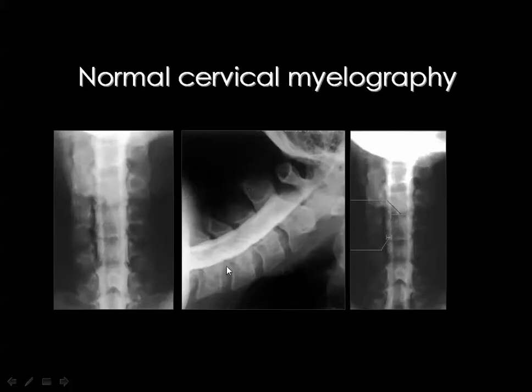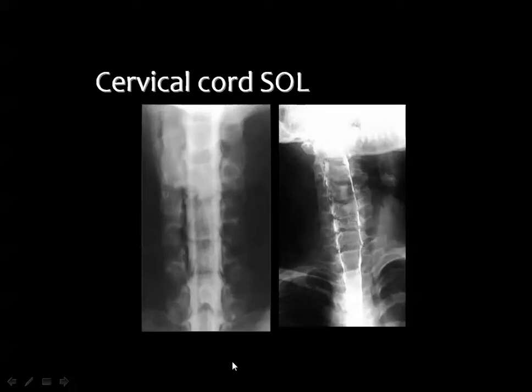So any small disc lesion which is going inside the spinal canal will indent this contrast column.